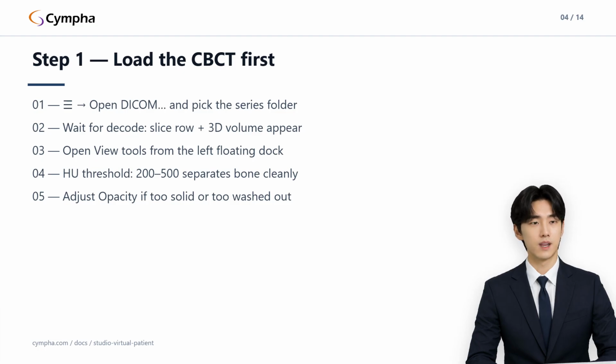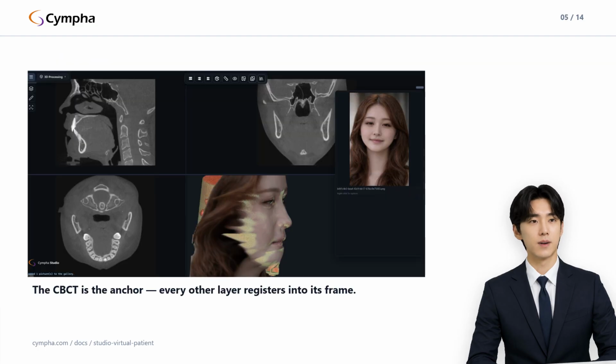And remember that HU threshold slider, because it comes back later. For the facial scan step, you'll drop the threshold down into soft tissue range so the rendered face itself becomes something you can click on.